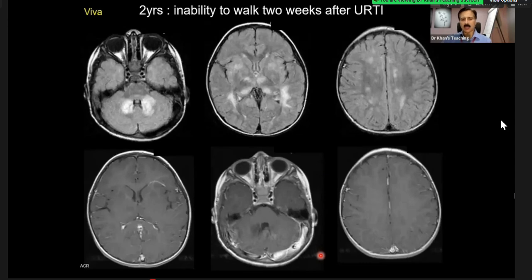And this is what the examiner is going to ask you. Look at the thalamus here. This is involved. Look at the basal ganglia, deep gray matter. Look at the dentate nucleus here, deep gray matter. So this increases your confidence. Of course, this is a giveaway. Maybe the examiner will not tell you, or you might like to ask it.